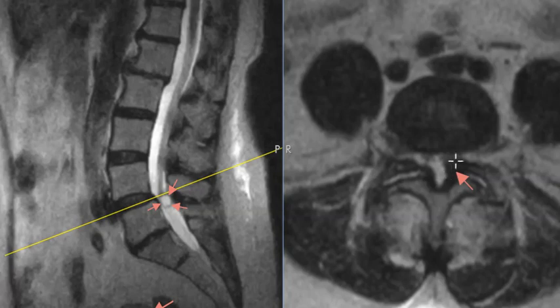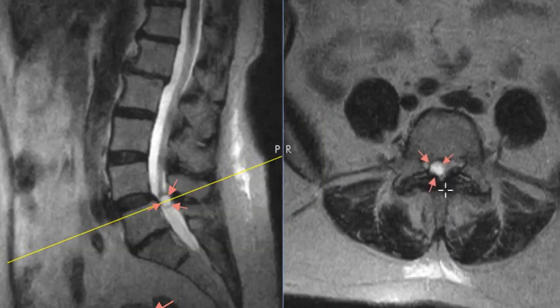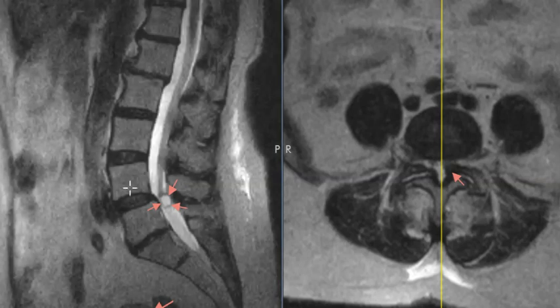So this is pushing on the left. The cyst is pushing on the right, so I have a severe central stenosis. There's no room. All those nerves are getting flattened and compressed, so this is going to require surgery to open that back up and then try to help fix this slippage, because the slippage is pretty significant and it's just going to get worse over time. So a synovial cyst, not a disc herniation, that is conspiring along with this facet arthritis and slippage to cause a severe central stenosis and cause her shooting symptoms.